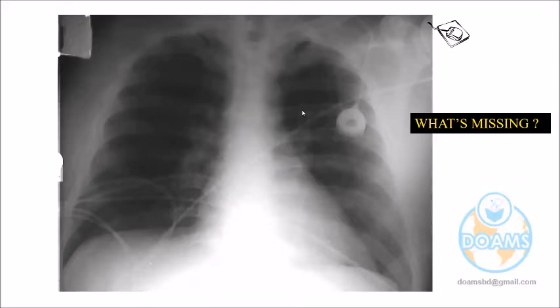So anything missing in the X-ray? Quickly. Anything missing in the X-ray? Very quickly. Something is not there. Don't be very serious. Look at grossly. Right side. Right side what? Dr. Hind, check your audio, doctor. Now it is okay. So right side is what?